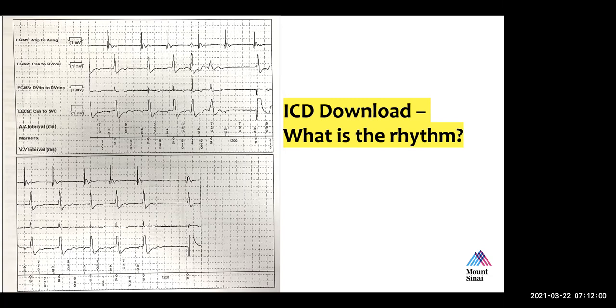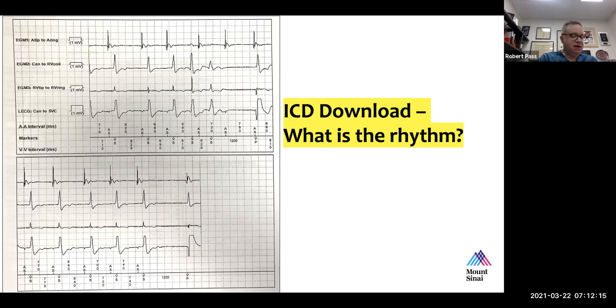So we're A sensing, V sensing. And then for some time, we don't sense the atria, so the ventricles start pacing. So the defibrillator starts pacing the ventricle. Okay, that's correct. So can you tell me, what do you believe the lower rate limit of this pacemaker is set at, based on that?